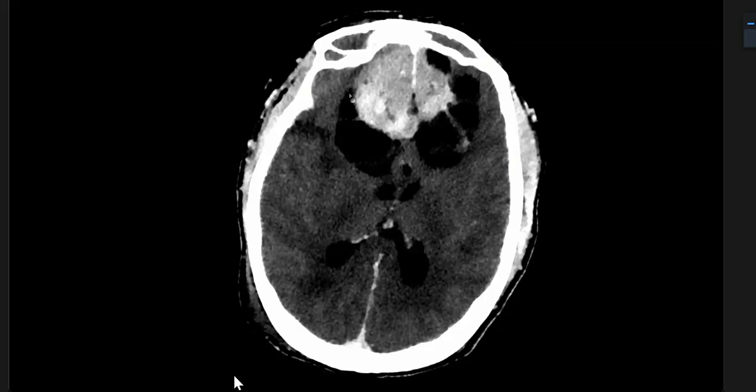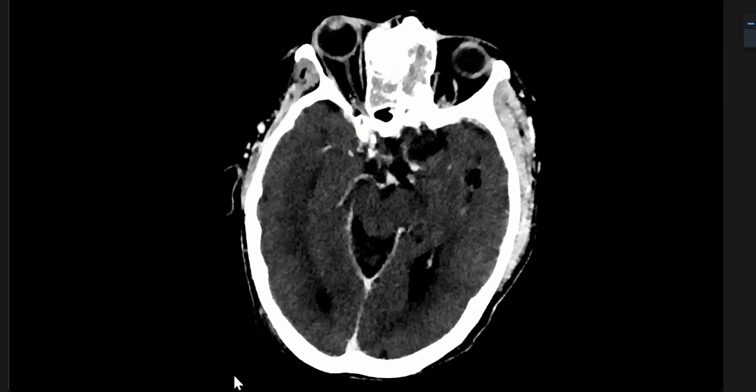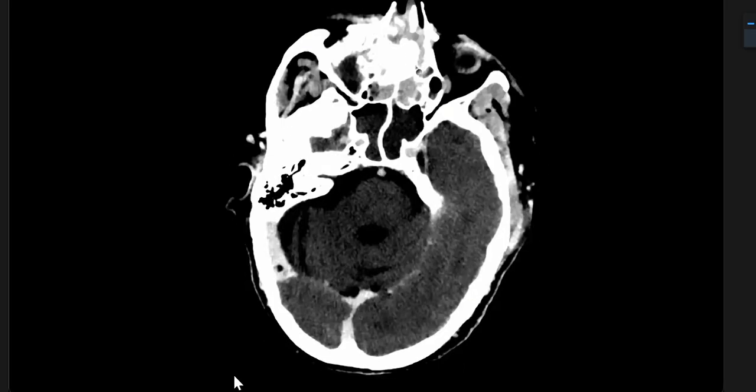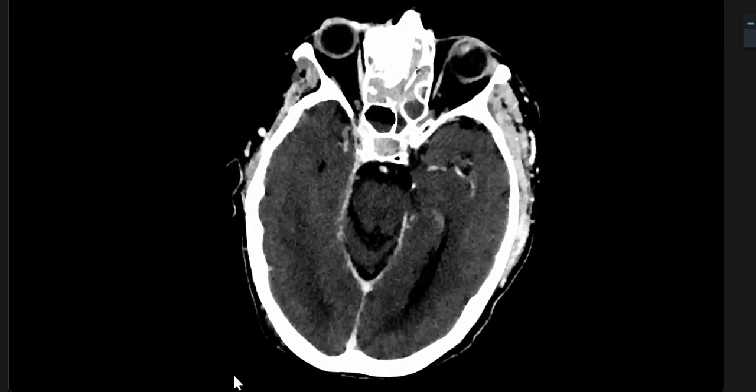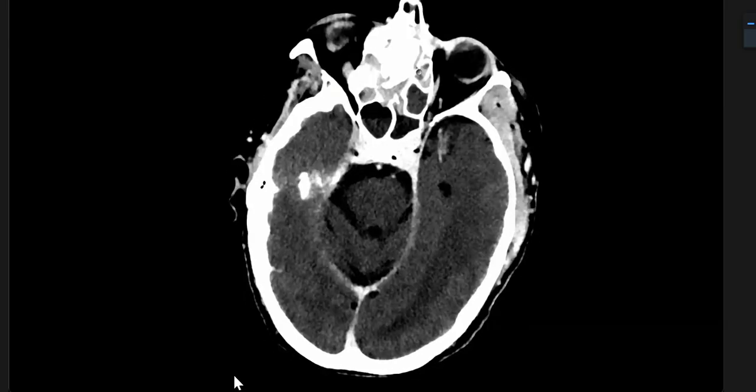That's quite a hallmark of this kind of malignancy, especially when you can see the whole nasal cavity is stuffed with this mass and there's no distinction. It's a process arising at the paranasal sinus and olfactory bulb level, an extracranial process going in intracranially rather than an intracranial process going extracranially.